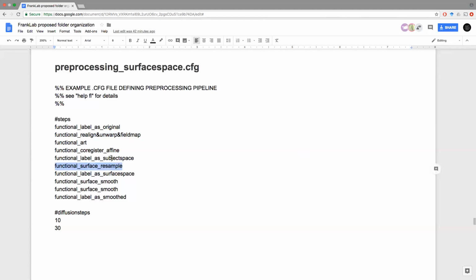So you have this version of the data that's volumetric in subject space. So this is the three-dimensional data before the import step, and that is going to remain the same. That is going to be something like mydata.nii, right? And a NIfTI file that is a standard 3D volume, well, 4D functional volume. And then when you resample, you get something like mydata.surf.nii, and that is a four-dimensional volume also, but it actually contains time series of two-dimensional surfaces, and that is in FS average space already.